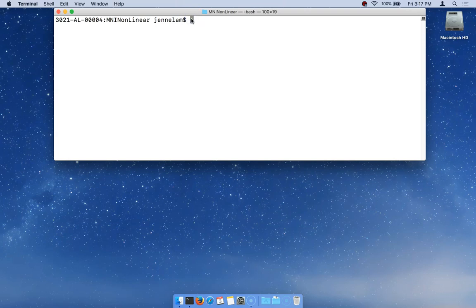Hi! Last time we explored features of Connectome Workbench WB View when a brain volume file was loaded. In this video, we'll explore some viewing features of WB View when we load surface files and brain maps, and show you how to save a basic scene file.